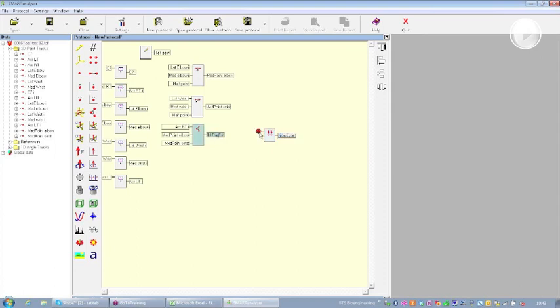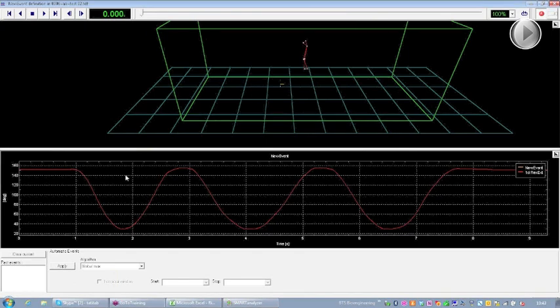Here I still have my reconstruction, and here I have the chance to tell my software to select the local max in this trial. I ask it to show me the maximum points over the whole trial, or I can decide to select them manually. So I will get the first one, the second one, the third one, and the last one.